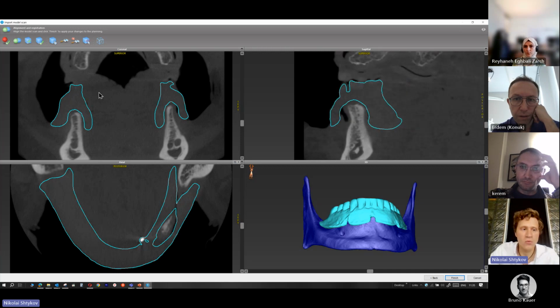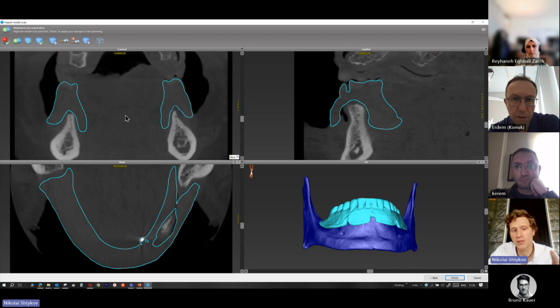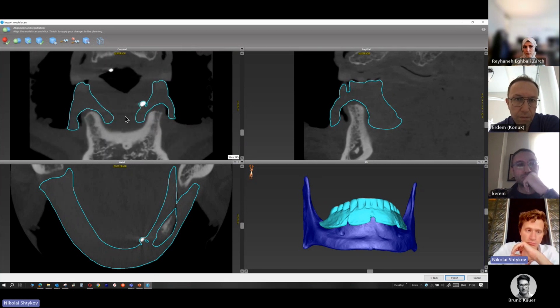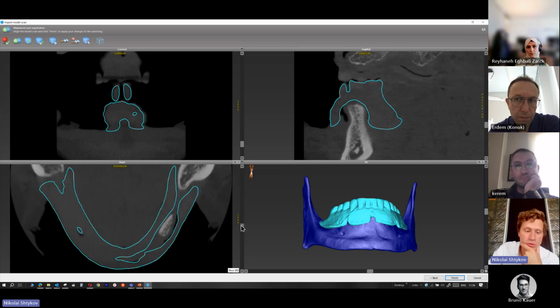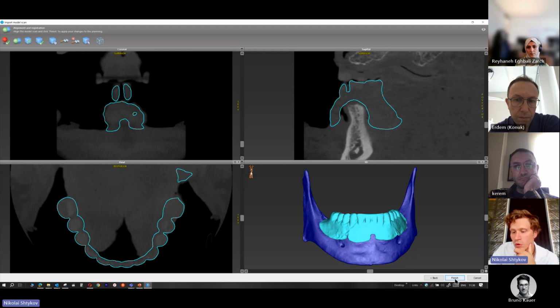And one of the main points is that when the patient makes the CT scan, he needs to make it in bite, because the prosthetics can be slightly moved if he doesn't bite it. Here I see that it's already good. That all is good, and I finished it.